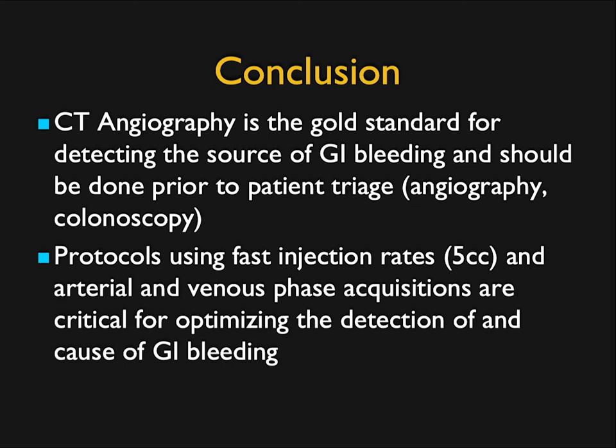Everything is protocol: fast injections, thin slices, rapid acquisition, and then looking at the images in coronal plane as well as axial with MIP imaging and volume rendering. All of it plays a part.